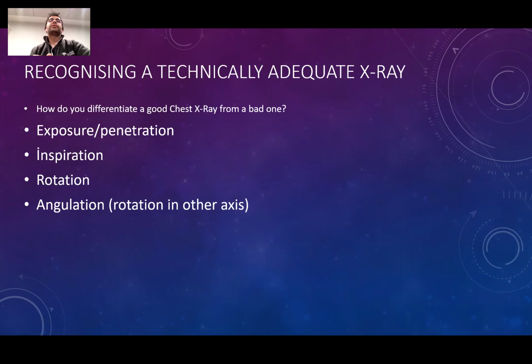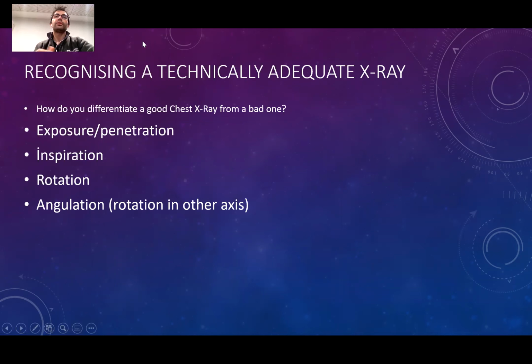So after finishing the projections, let's come to evaluating the technical adequacy of an X-ray. This can be a very good exam question. Let's go over it. So how do we differentiate a good chest X-ray from a bad one? This is how we answer the question.